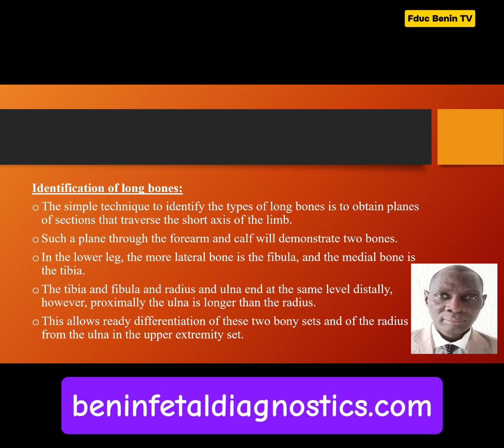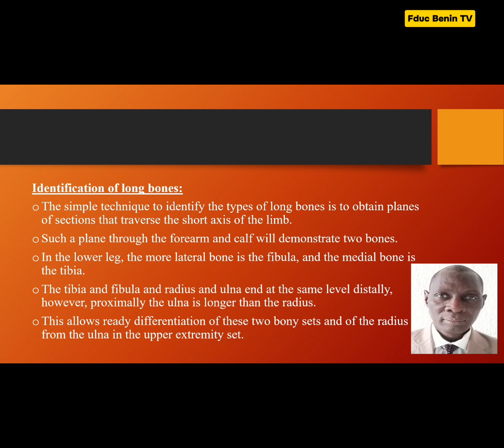Now, how do we identify the bones concerned? The simple technique to identify the type of long bones is to obtain planes of section that traverse the short and the long axis of the limb.